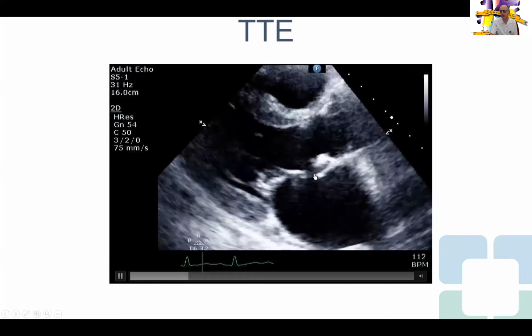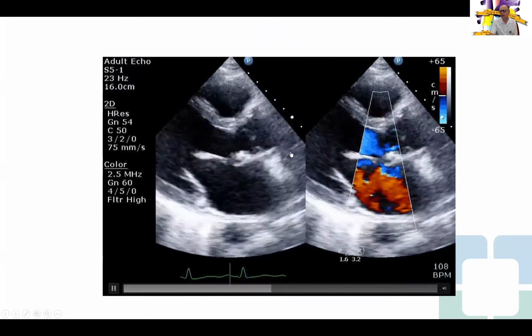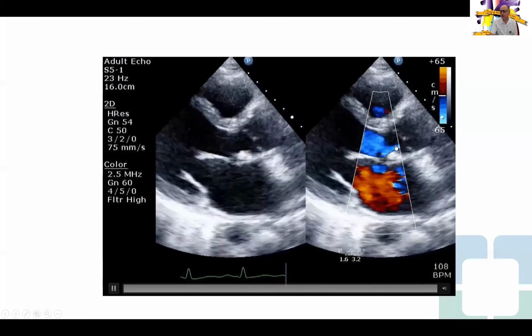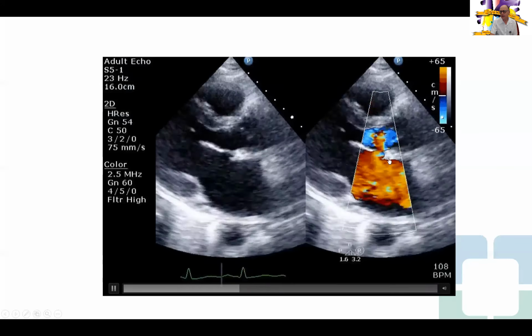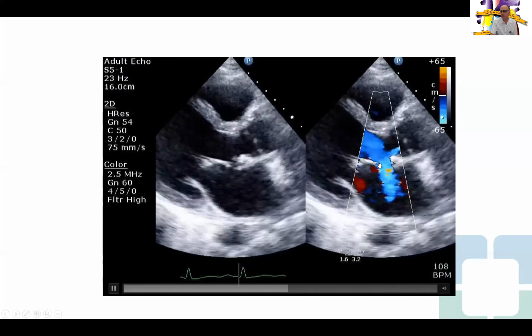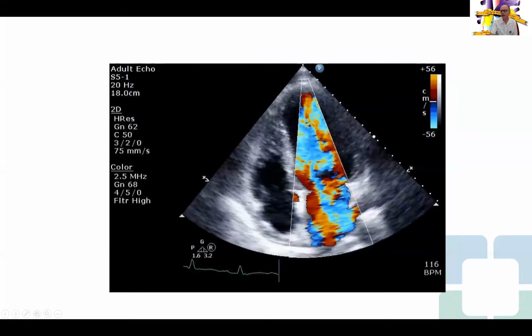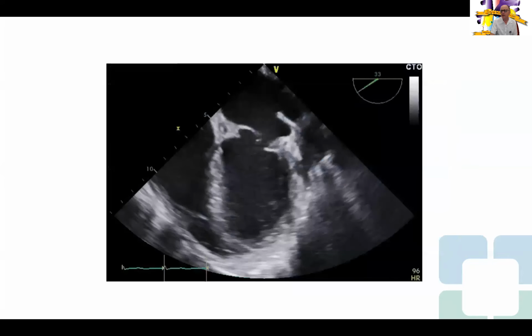Here we have this echolucency in it. Right away, again, another mechanical complication, unfortunate for this patient, where you can see a leak from the aortic valve with a jet lesion hitting that area in the mitral valve, over time probably creating a perforation in that leaflet with a leak. So this is a new infection with a new mechanical complication, a different valve than the valve we fixed. Again, extensive mitral regurgitation, severe, torrential, biblical, whatever way you want to say it.